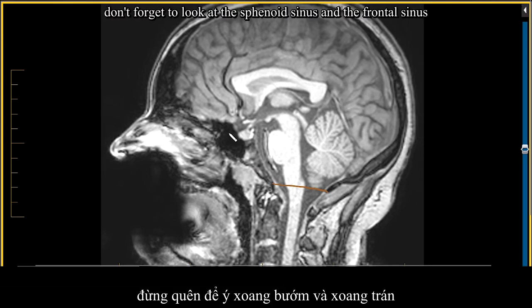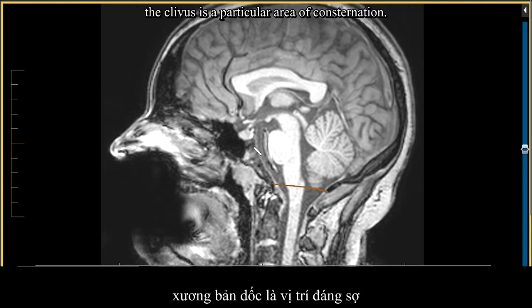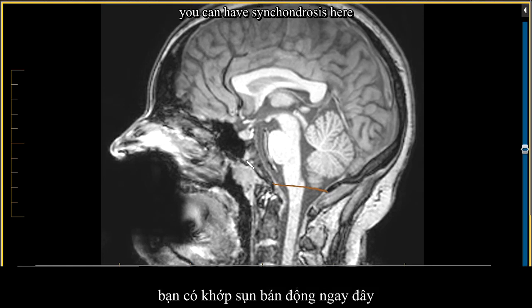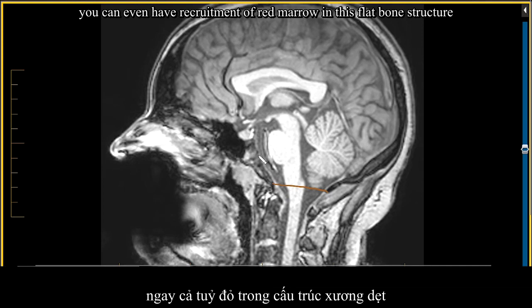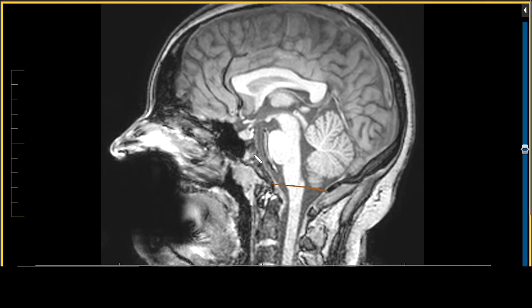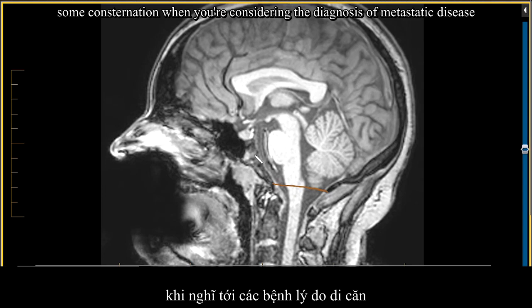Don't forget to look at the sphenoid sinus and the frontal sinus. The clivus is a particular area of consternation. You can have synchondroses here. You can have bone islands here. You can even have recruitment of red marrow in this flat bone structure, and sometimes that may produce some consternation when you're considering the diagnosis of metastatic disease.